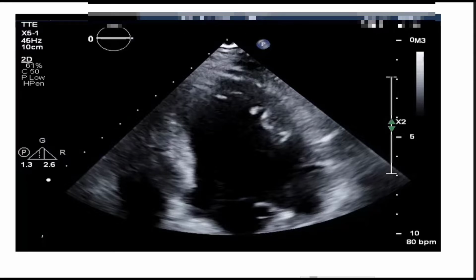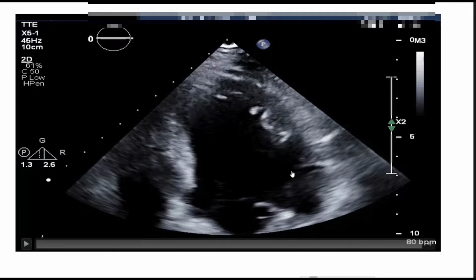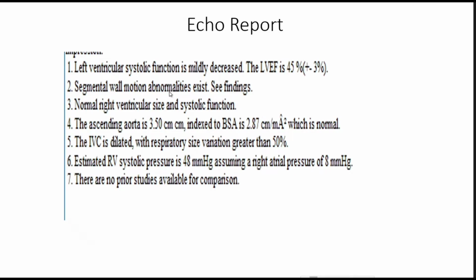Now, some strain or not strain, but some contrast images may have been nice if the patient didn't have a sensitivity to it. And then to Ken's point, in the previous case, some strain might have been helpful as well. Okay. So I think those are just points to remember. So the interpretation was that there was this apical wall motion abnormality, and so they centered on to coronary angiography.